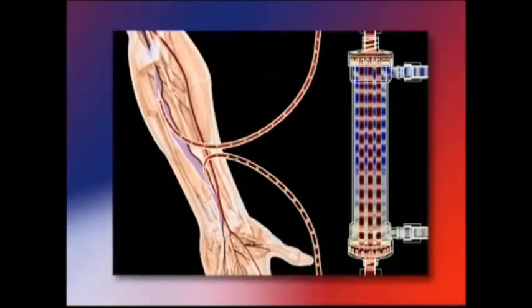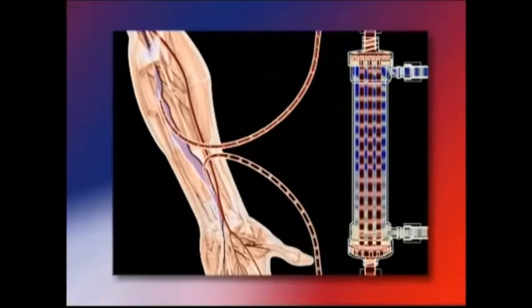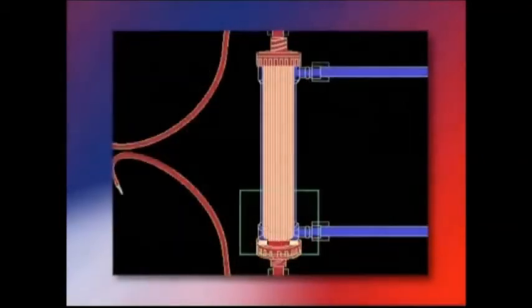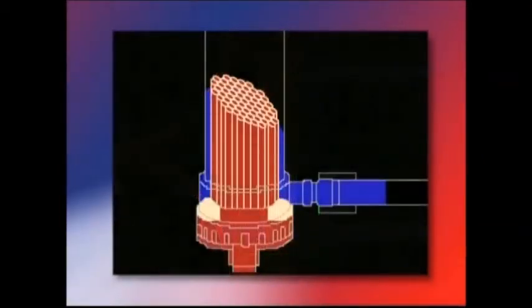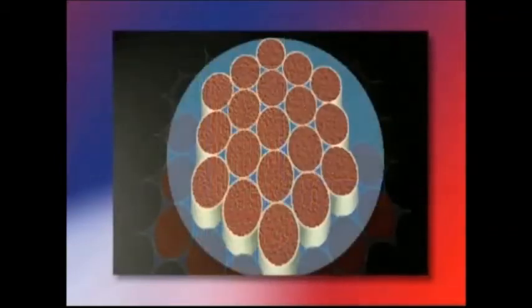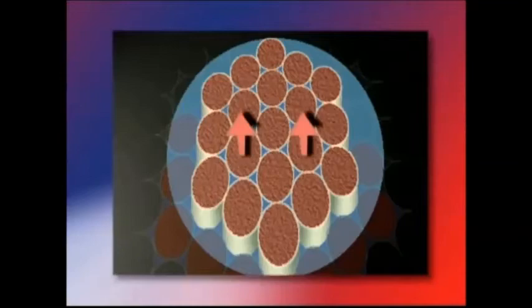An artificial kidney, or dialyzer, can do some of the functions of a normal kidney. The dialyzer contains lots of very tiny narrow tubes made from a semi-permeable membrane. Blood is pumped through these tubes whilst the dialysis fluid flows around them.